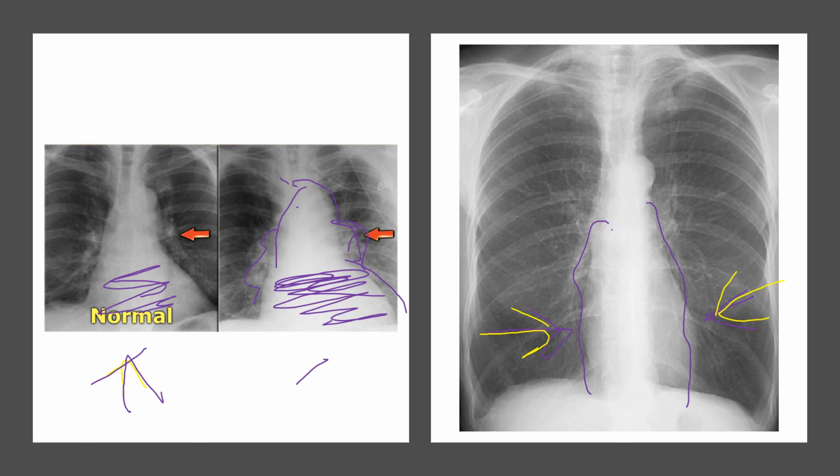So if you're looking at an x-ray and you see rib after rib after rib, right? It's a lot of volume expansion. Not only that, but that volume is expanding so much to the point that that heart is just tall, narrow, column-like.